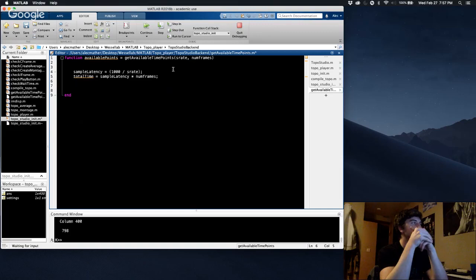Right. Because we're going to start at 0. We're going to have a 0th time point. So the adjusted total time is going to be your total time minus your sample latency.